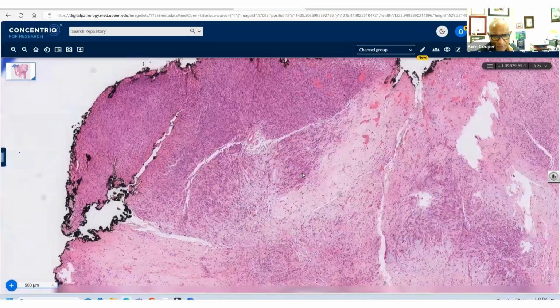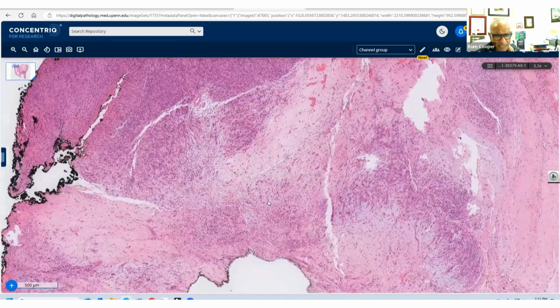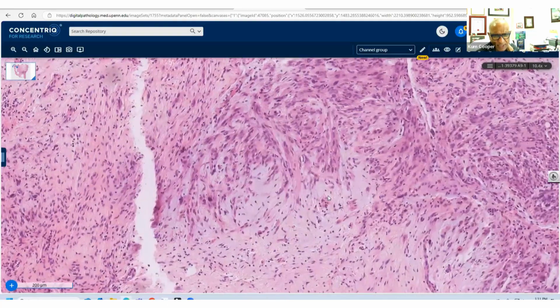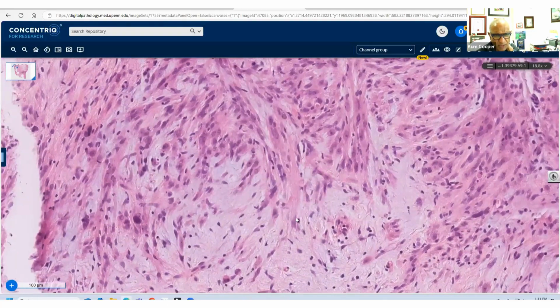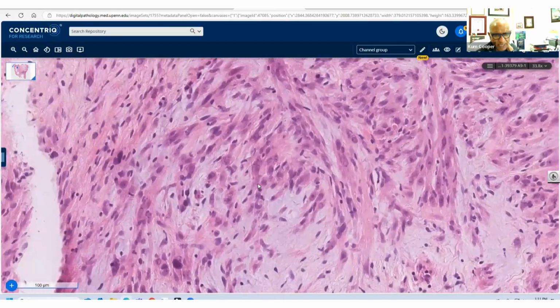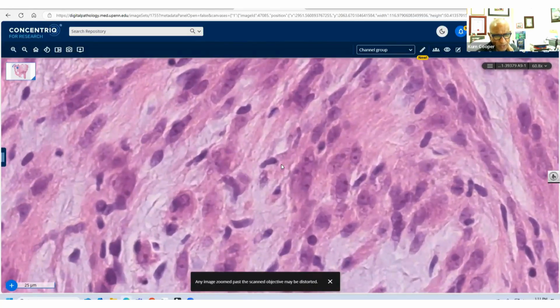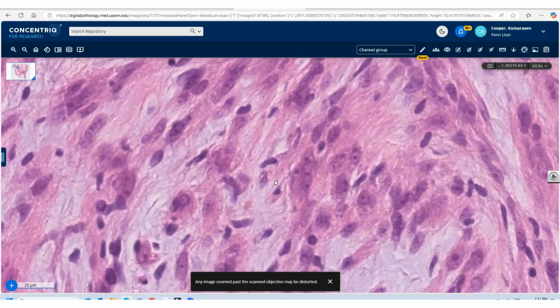There's more residual tumor here. I didn't go into this area, but there's some myxoid matrix here as well. I like to see this gray-blue material to call it myxoid. And again, the nuclear pleomorphism is pretty evident here, just on higher power, with prominent nucleoli. Now, would anybody like to give me one more stain that they would like to do? H3K.